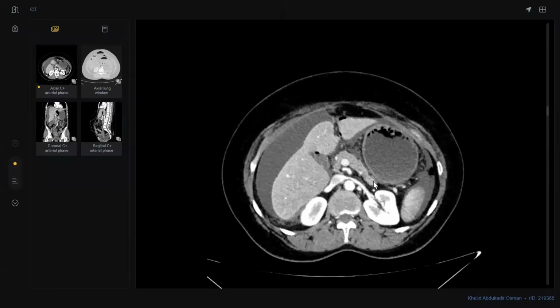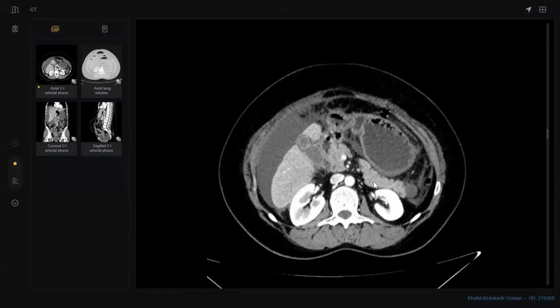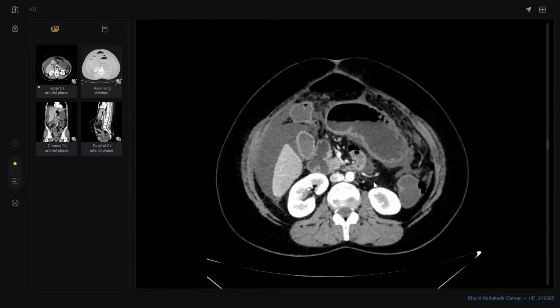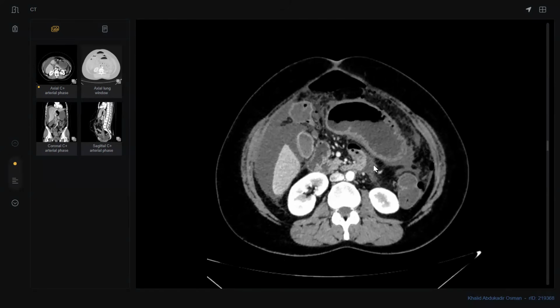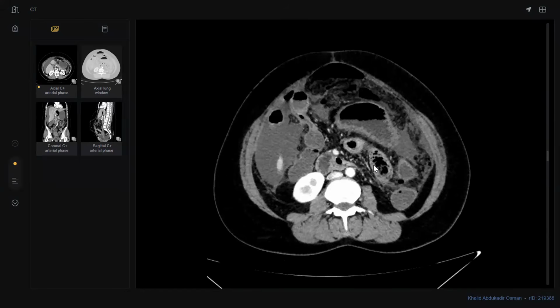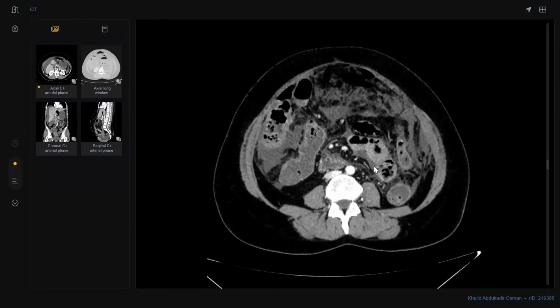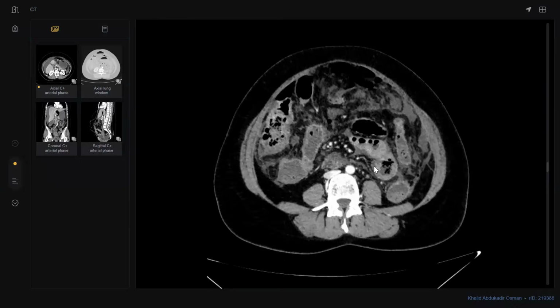But yeah, having a look at the abdomen, this is a CT with contrast. I did notice there is extraluminal air seen here, at the upper cuts of the abdomen. This is likely a pneumoperitoneum, and I will also confirm it by looking at the lung view. I'm trying to see where the origin of this pneumoperitoneum is, because it means there is a hollow viscus perforation.